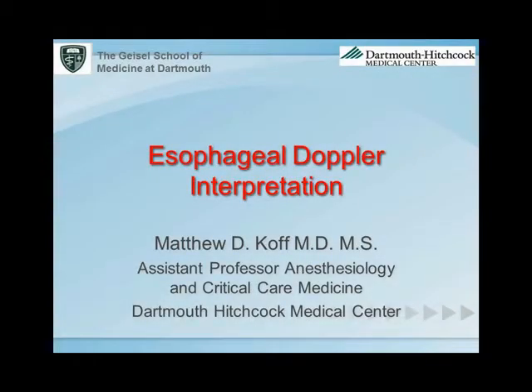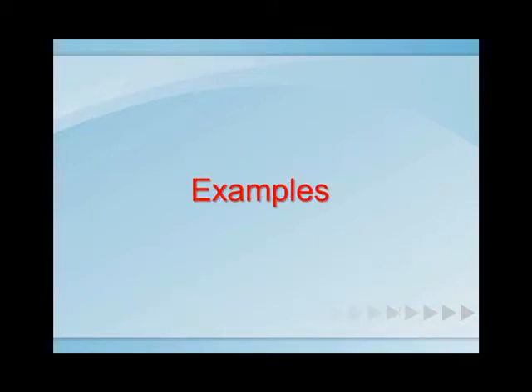I'm an assistant professor of anesthesiology and critical care medicine at Dartmouth-Hitchcock Medical Center. This is an educational video about the esophageal Doppler monitor. Here are some clinically relevant examples that you may see in patients.